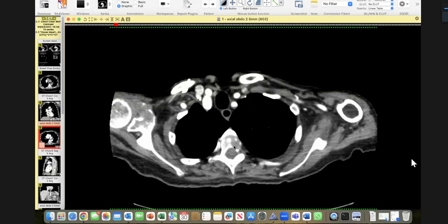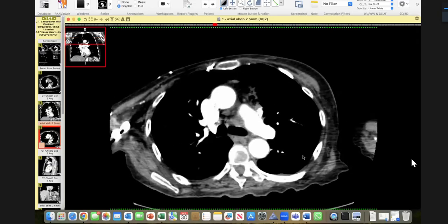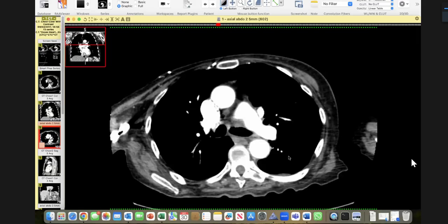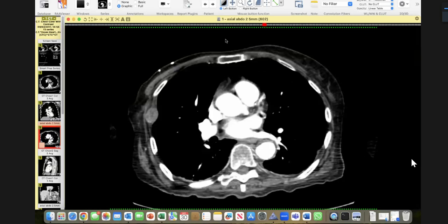There were other bony mets, for example, here, and quite a few mets. There was one lesion in the rib on this side also, but the one which I showed you was also there. So again, the point is the same feedback as the first two candidates: try to close the case, try to close it and go next.